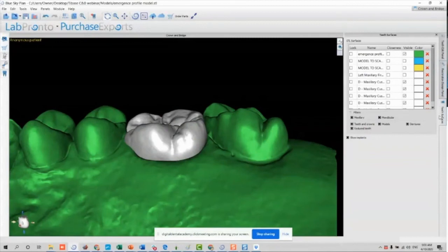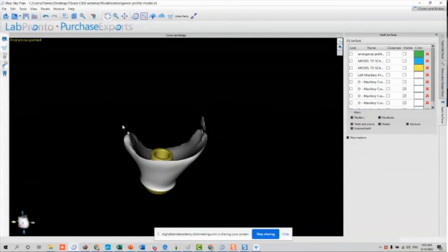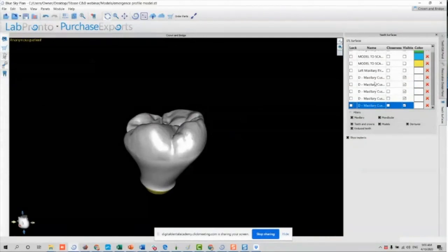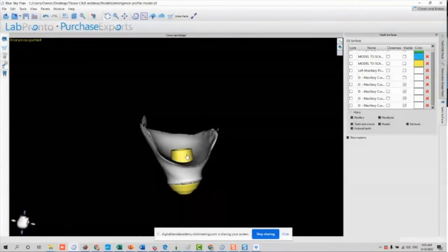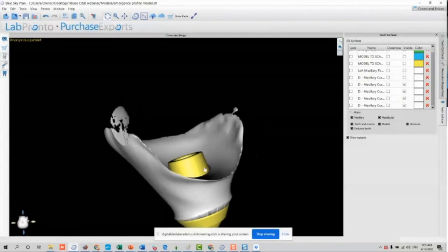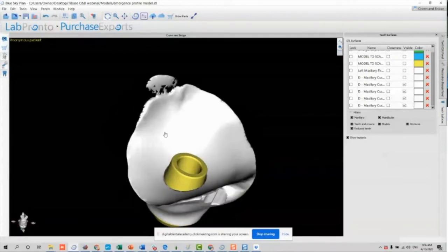As you can see, you can go to the teeth surfaces, and now let's see what we have in here. On the first, this will be positioned in, I'll call it in size. Okay, so first of all, of course, is a crown. Second of all, this will be your emergence profile. This you can actually 3D print it or mill it as it is right now. And what you will do is you will position this in your tie base. You will cement it with temporary cement. If you want, you can fill this up with flow resin or packable resin, whatever you choose.